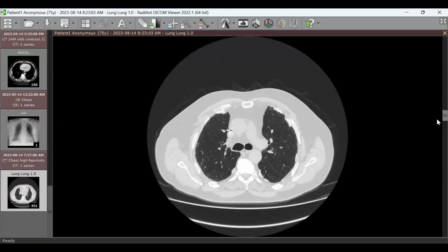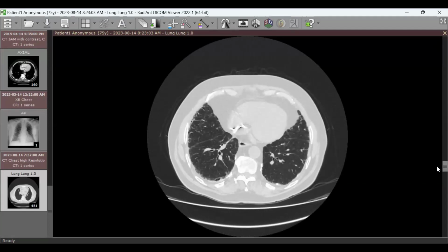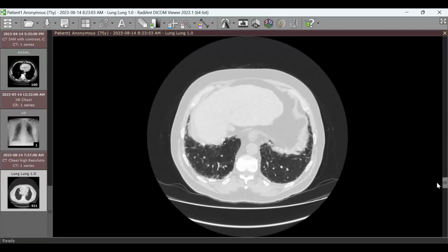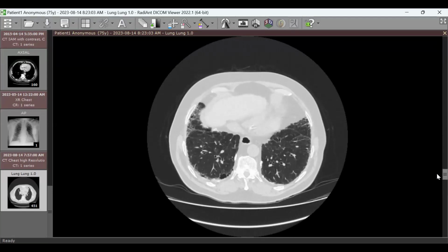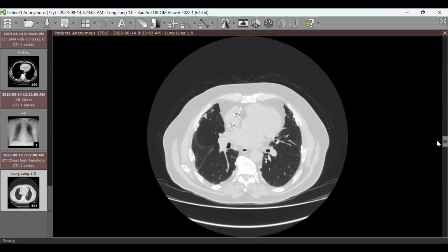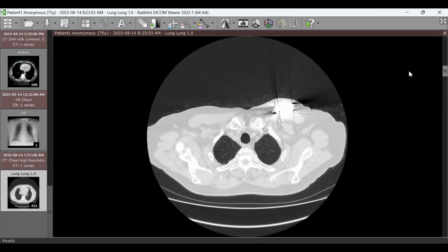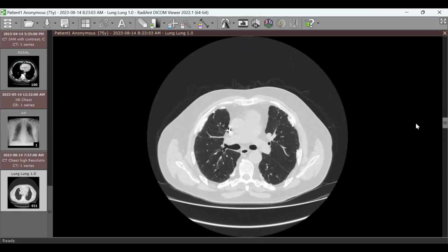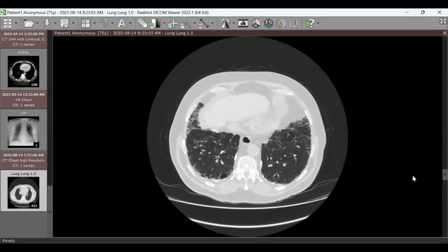So the same as you described, there are bilateral pleural plaques, and here, with also paraseptal emphysematous changes. Why do you think it's paraseptal emphysema? We have bleb-like changes. Okay.